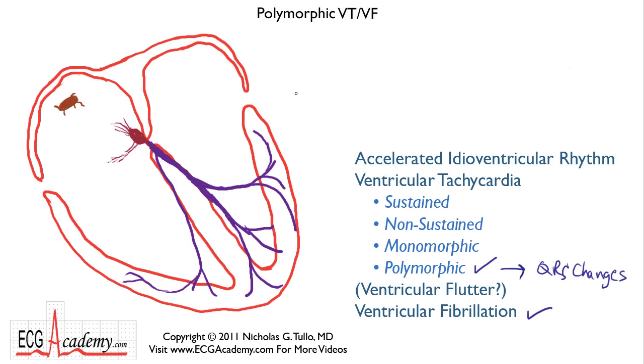It's very easy to recognize this, and just like most ventricular tachycardias, you expect to see heart rates between 120 and maybe 250 beats per minute. That can also get up to as high as 300 beats per minute, perhaps. When you get to a polymorphic ventricular tachycardia greater than 300 beats per minute, that meets the definition for ventricular fibrillation. When you have less than 200 milliseconds in between beats and a polymorphic ventricular arrhythmia going on, that's almost always multiple short circuits in the ventricle all going at once.